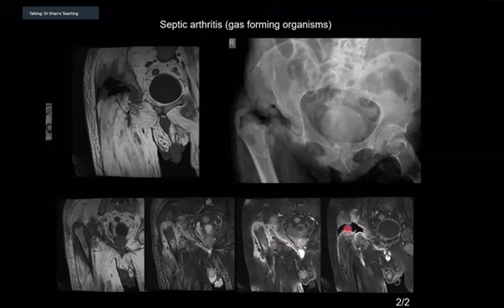So this was an observation type of a film. Observation means the film is easy. We can see gross findings there, and we can pick up. But this finding clinches the diagnosis on a plain film. Okay, well done. Thank you.